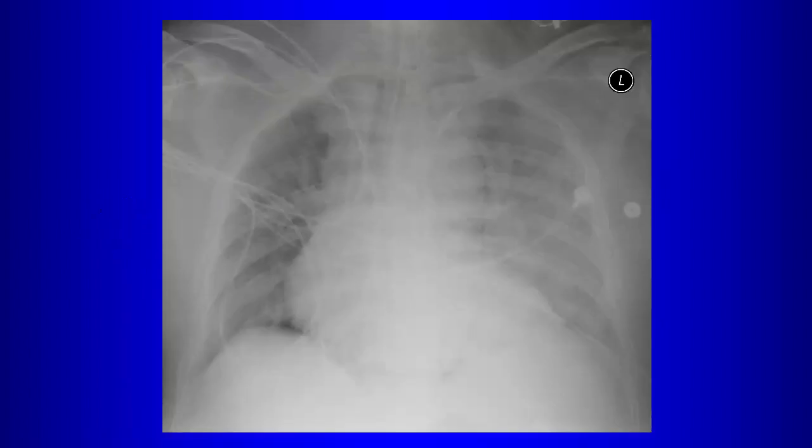So here on this chest radiograph, we look at it and it looks like there's a lucency adjacent to the descending thoracic aorta, right? So that looks like a pneumomediastinum. But it's funny, if I cover that edge with this piece of paper, you see that the lucency along that region disappears. So what is it that we're really looking at here? Why do we see this lucent line coming down alongside the descending thoracic aorta? What is that then?